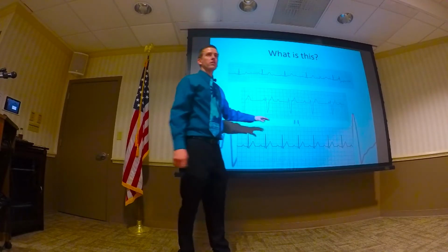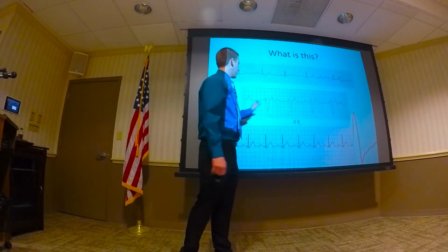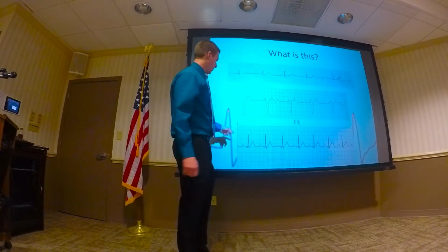Now, what is this? So wide complex, right? One of the first things you need to assess is whether it's narrow or wide. It's wide. And the QRSs march through. The P waves march through. And so this is third degree heart block, right?